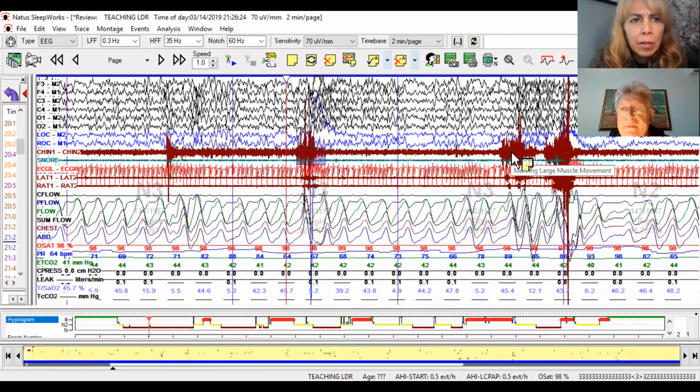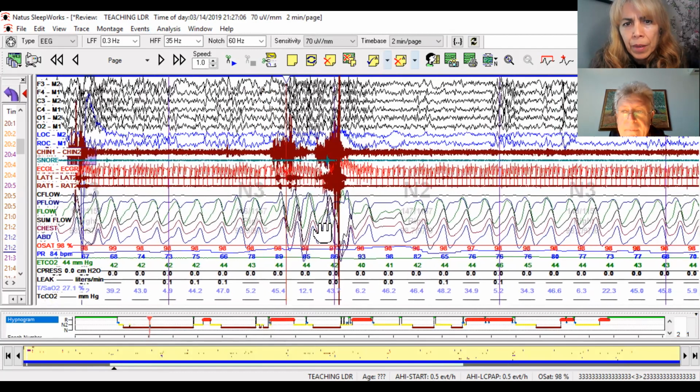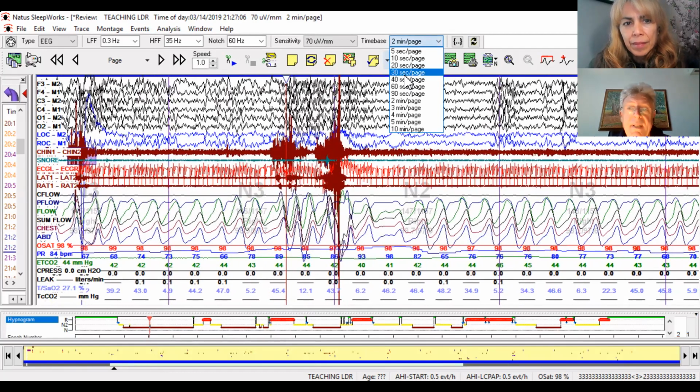the 1 second. Yeah. So let's put this one in the middle. And this is a good example of what we were talking about, if there's 1 second in between. But if you see this movement with this time scale, it is very hard for you to say if there is a separation of 1 second or not.